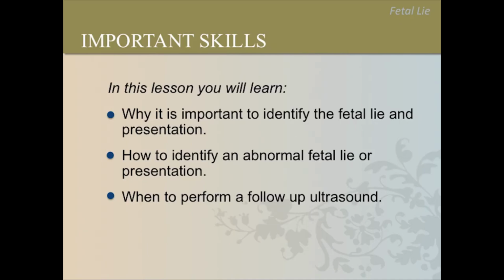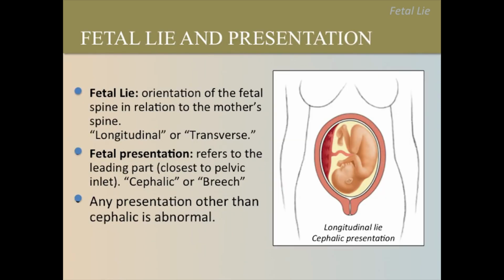In this lesson, you will learn three main skills: why it is important to identify the fetal lie and presentation, how to know when it is abnormal, and when to perform a follow-up ultrasound.